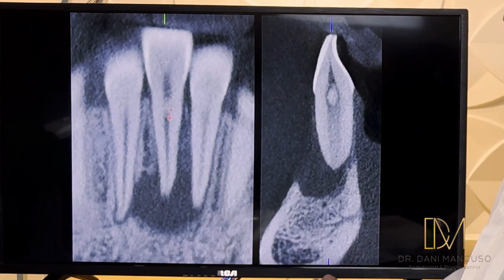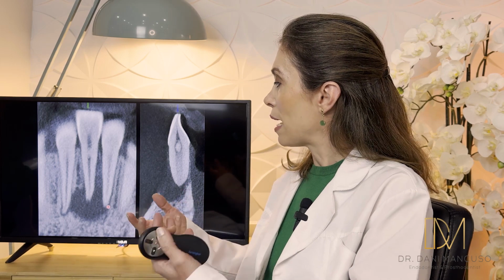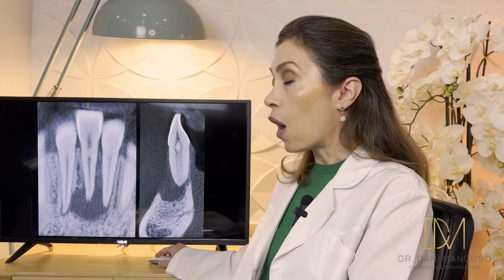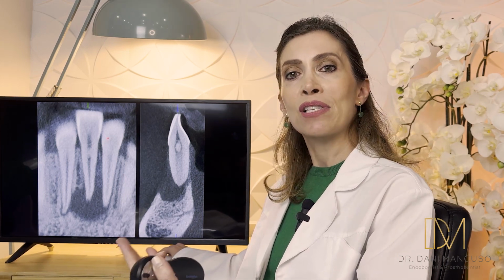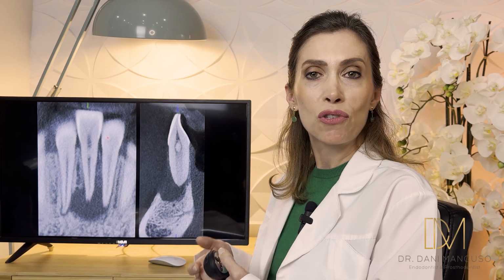The CBCT was done, and as you can see, the periradicular radiolucency is starting to go sideways towards the adjacent teeth. But when you do the sensibility test, it proves to you that those two teeth were completely normal and alive and in function. There are cases where, for example, the test with the endofrost gives you a bit of a doubt whether this tooth responds to cold, responds to electric pulp test.